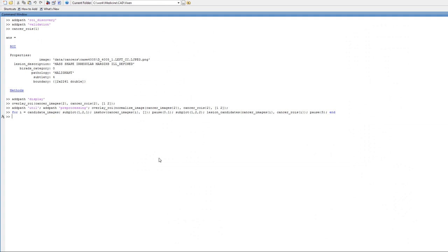Yes, this has finished. Now I'll also demonstrate the ability to analyze all of the mammograms and return a binary, is this normal or is this cancer, for the entire data set. So I've basically written some validation functions. And since we've already extracted the features, this is actually very, very fast. We've taken the 30 normal images, 29 malignant, and we've returned both the specificity, that is 1 minus the false positive rate, and the sensitivity, which is the true positive rate.